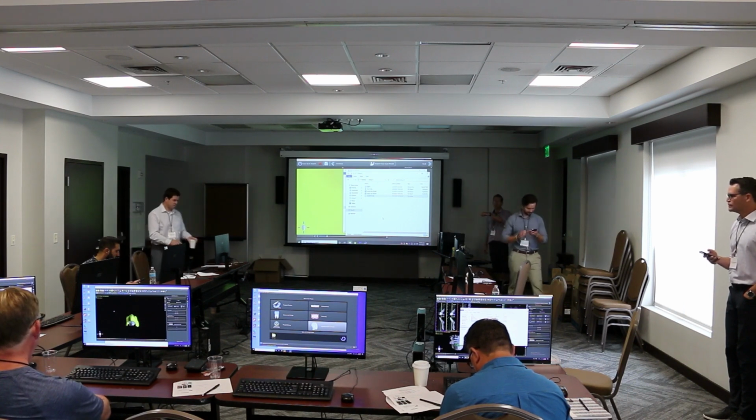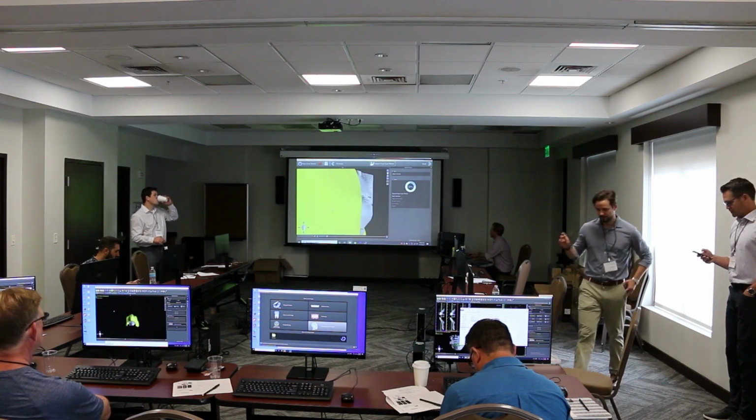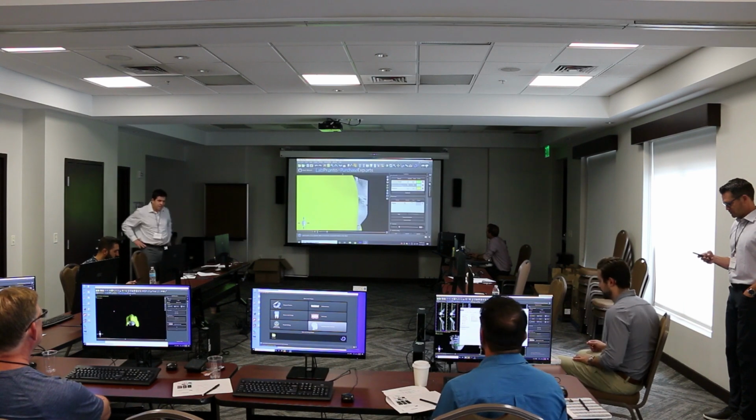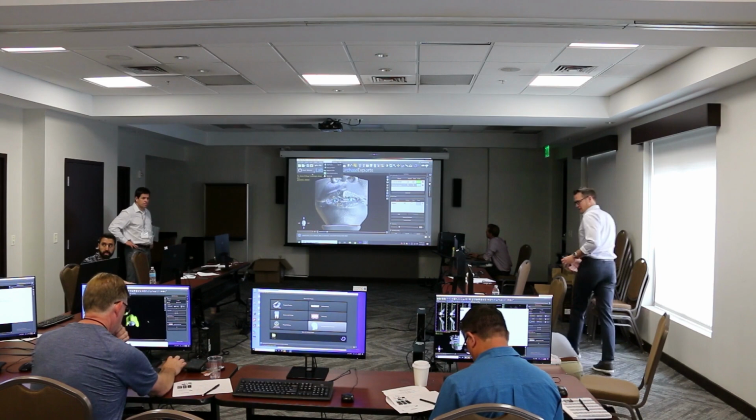All right, so Dr. Anderson, Dr. Pope needs it. All right, so we're all good now. We got the right file. I'm going to delete my other face right there. Oh yeah, here. Oh, you're good.